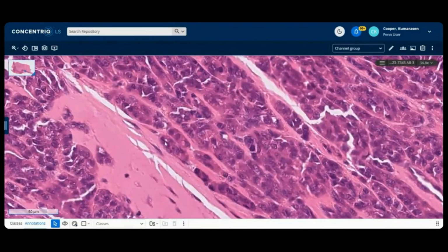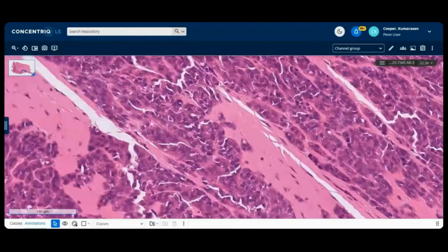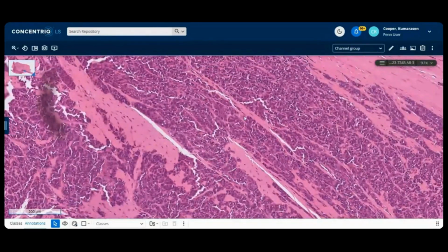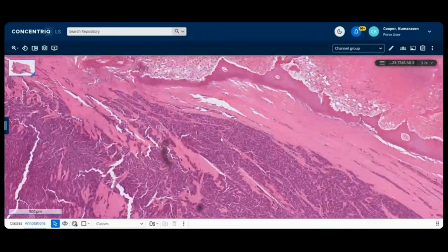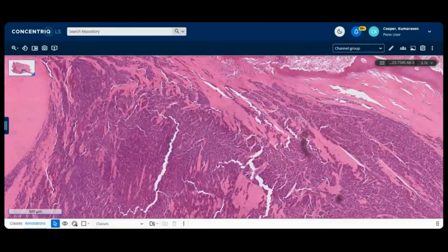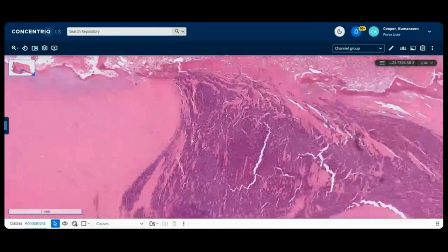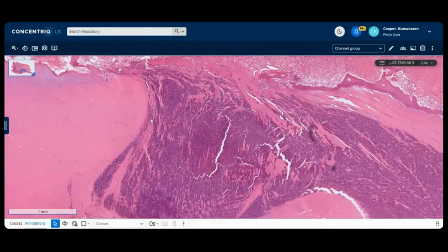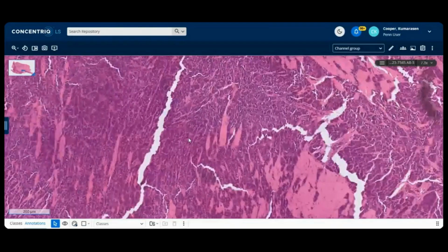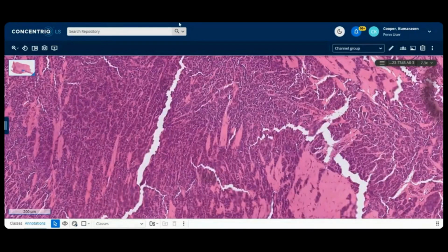cords and nests. This collagenous background may really be some of the ligaments, or that may just be part of these. Yeah. Okay. Any other thoughts? All right. If you want the other melanoma markers, they are also positive. So take your pick. Okay. What are you going to do, Heba? And Sheena is saying translocation-associated sarcoma.